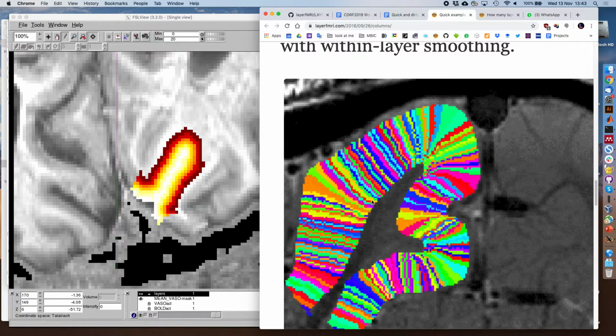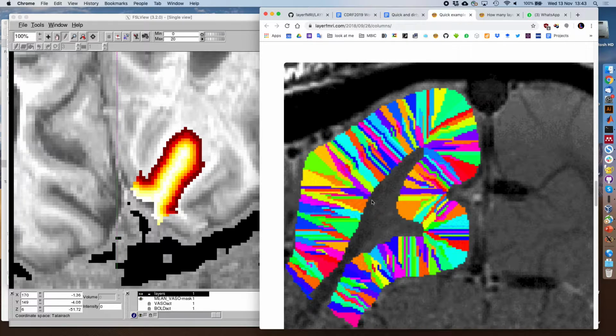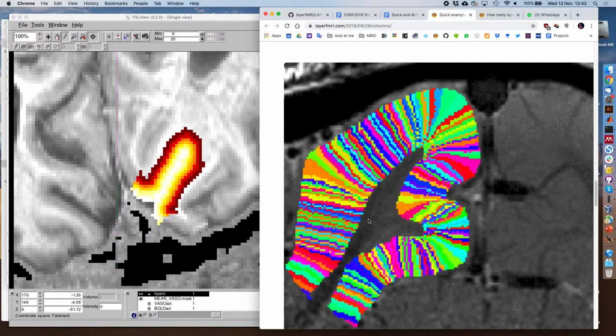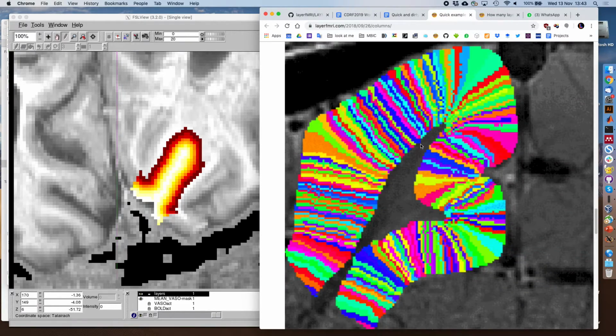Maybe one important thing to note here is that you can also change the number of layers, not based on voxel steps, but just by scaling it later, which allows you to choose any number of layers you want, for example, as done here. So it's basically just trigonometry. It's only looking at distances with some inherent assumption that every voxel in white matter must have a nearest voxel at CSF.